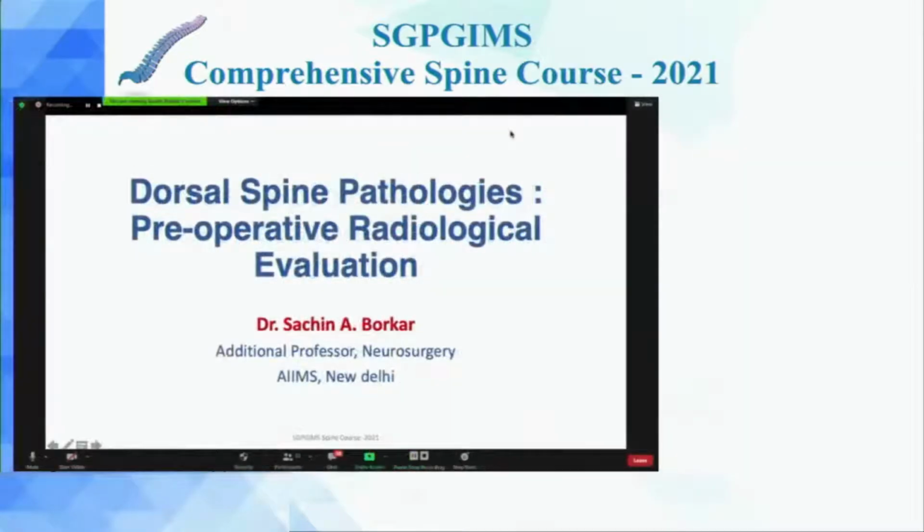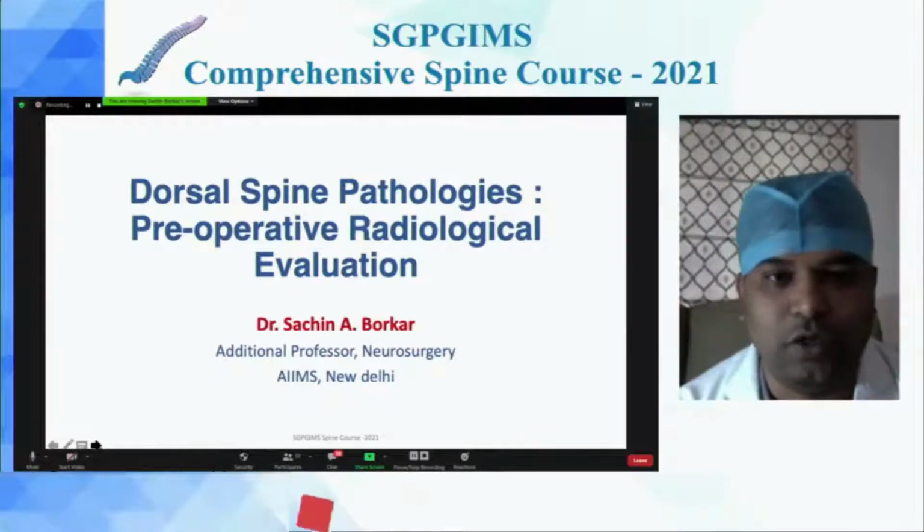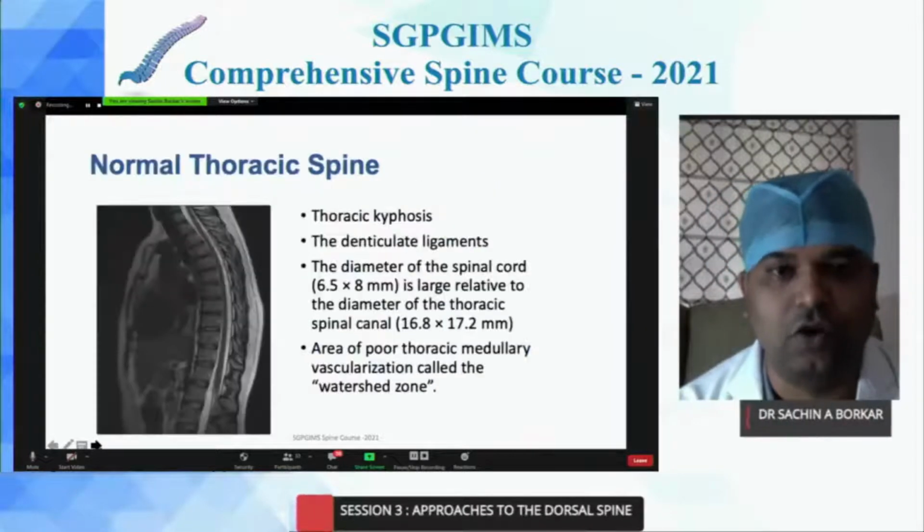I shall be talking about the preoperative radiological evaluation for the dorsal spine pathologies, and I'll take you through a series of cases through which I'll try to drive home the point of the importance of radiological evaluation.